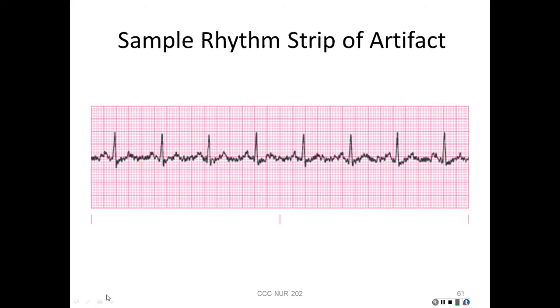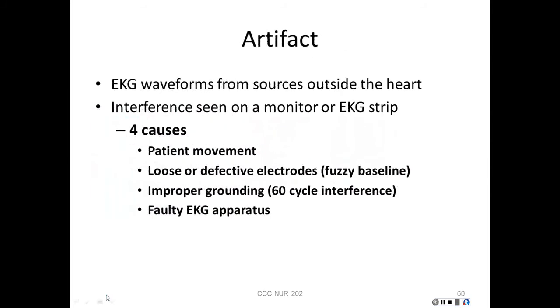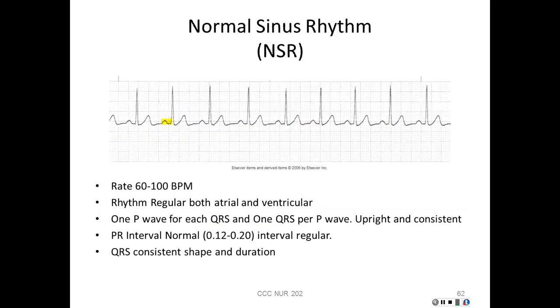Again, I apologize, I'm trying to learn how to use some new tools with this. I lost my cursor. If we look at our block here, we can see this large block contains 5 of the smaller blocks.